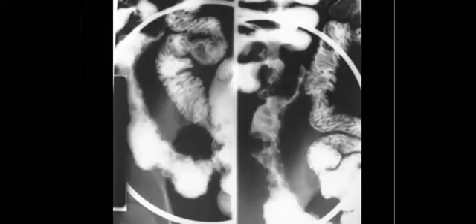Yes. So they like to mention that when it is involved, there is fibrofatty proliferation. They like this description in the pathology. They like to mention that it can be fibrofatty inflammation, right? And on CT, yeah, in CT, exactly.